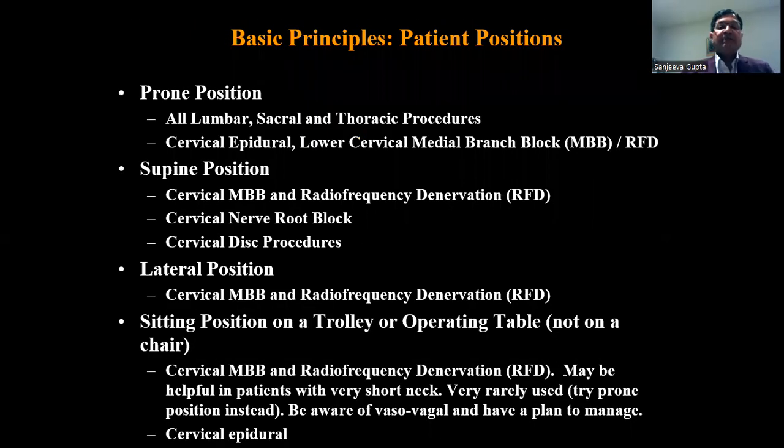Some more basic principles. Patient position is extremely important. Prone position can be used for all procedures at the lumbosacral level as well as thoracic level. Cervical epidural can be done in prone position. Lower cervical medial branch block, I prefer to do in prone position. Upper cervical medial branch block, I prefer lateral position. Supine position, cervical medial branch block and RF can be done. Cervical nerve root blocks, if you're doing them, and cervical disc procedures, if you're doing them, can be done in supine position.